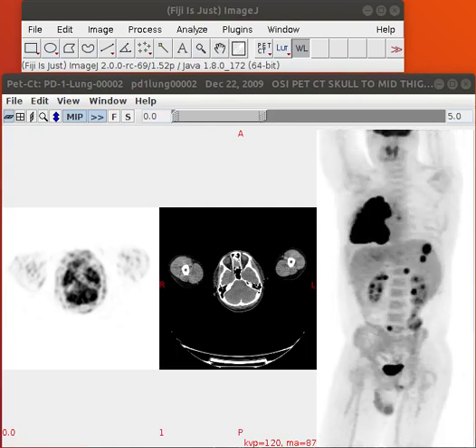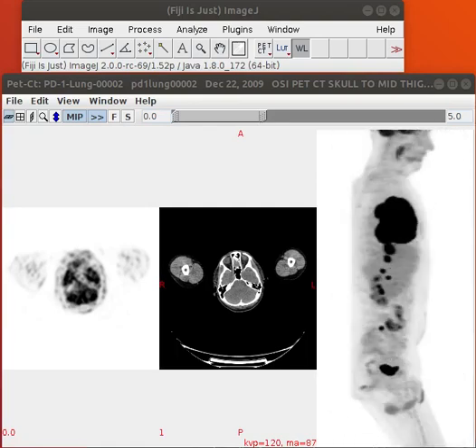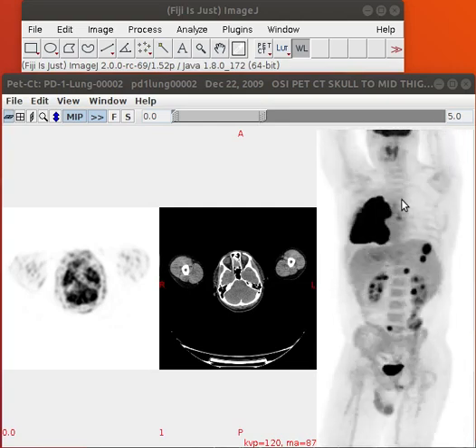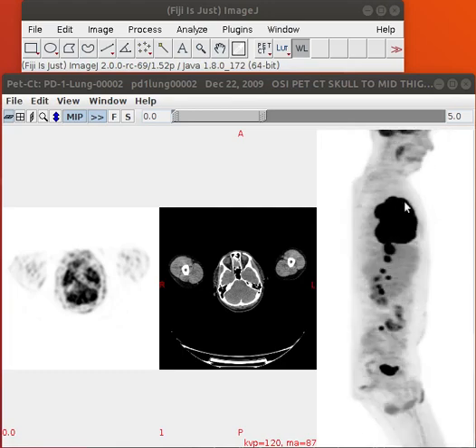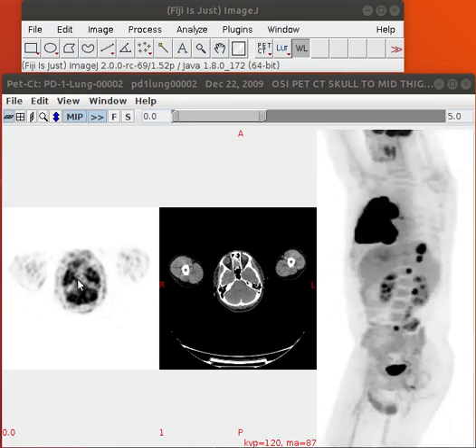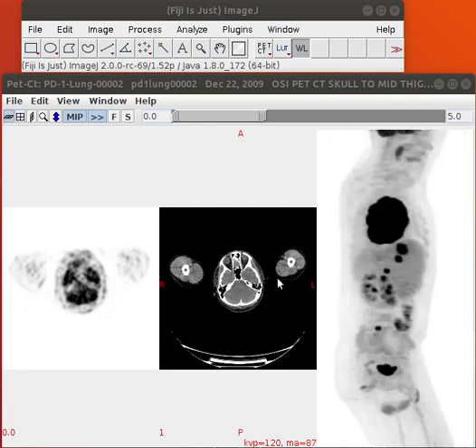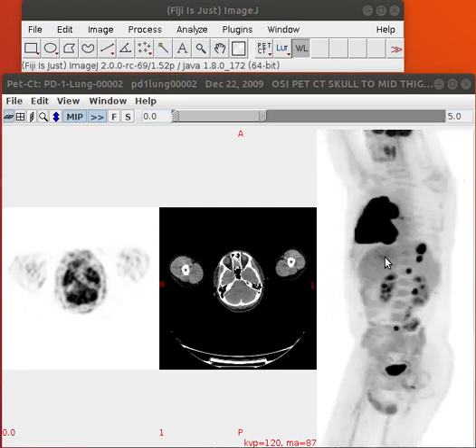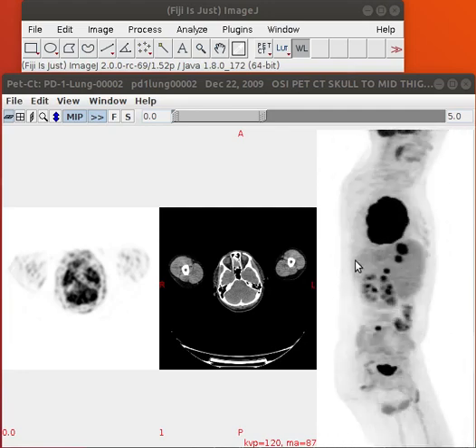This is a basic display demo of the PET-CT viewer. When the study comes up, it has three different objects on it: the MIP, which is rotating, the PET, and the CT. It's rotating to give you a concept of the 3D location of the tumors.